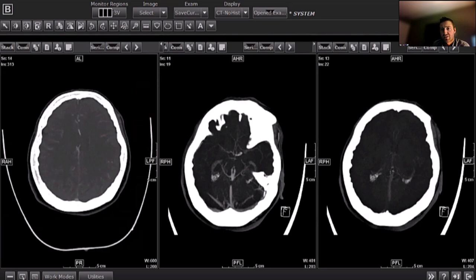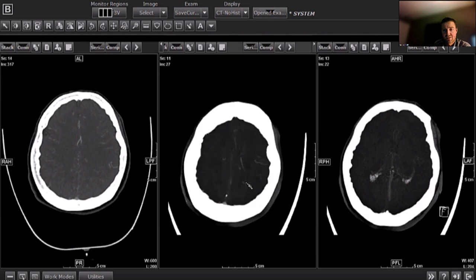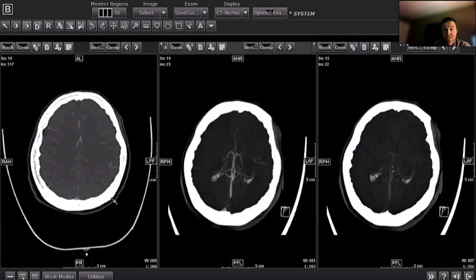It's one of the tricks with the triphasic CTAs, especially for the small vessel occlusions. They're not just useful for large vessel occlusions. Always look at your early and late delayed phase images, especially if you don't see any areas of ischemia or any definite intraluminal thrombus or abrupt vessel occlusion, because it's amazing how many times you'll see these little areas of increased contrast density or prominence in the peripheral vessels, and you can go back onto your arterial phase images and identify tiny M2, M3, M4 thrombi.